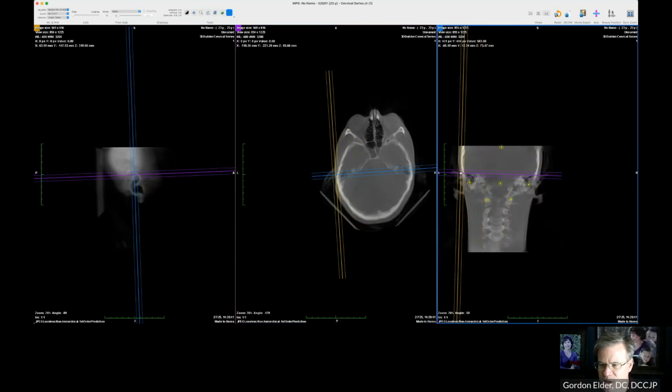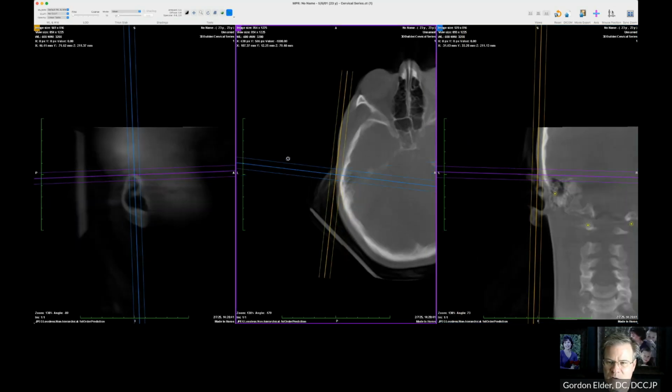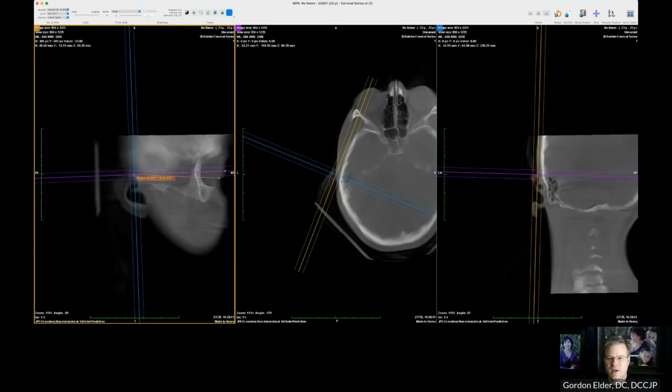All right, let's go over to the left ear. 4.5, pretty much the same for this lady. She's fairly consistent from left to right, but 4 degrees is a fairly significant number in my mind, 4.5 degrees. So instead of just using the slope angle that we measured, I'm going to add 4.5 degrees to it when I walk up to the patient.